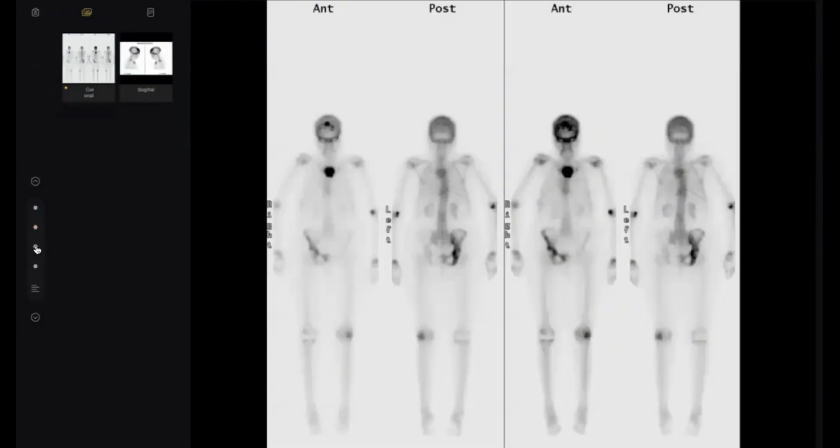First, I wanted to show you this one. Okay, tell me what happened. This is a bone scan, HDP. This is the left. There is increased uptake in the right hemipelvis and in the sternum as well.